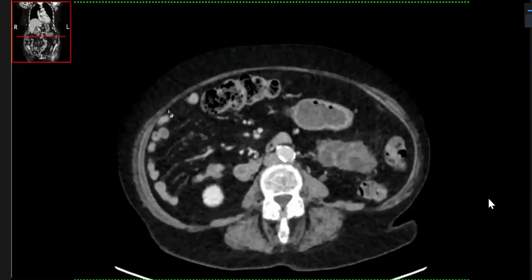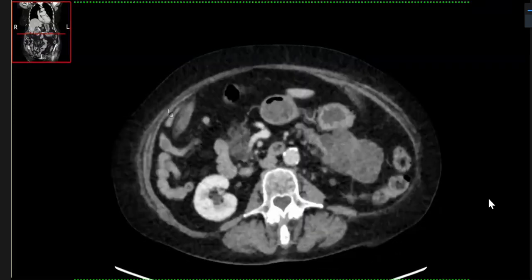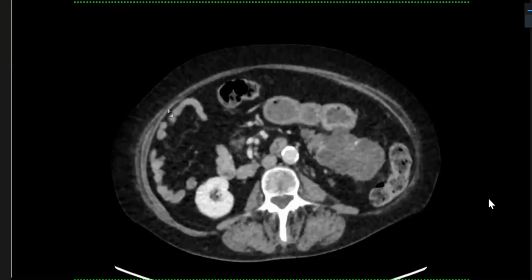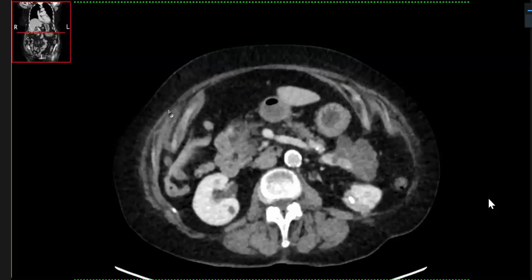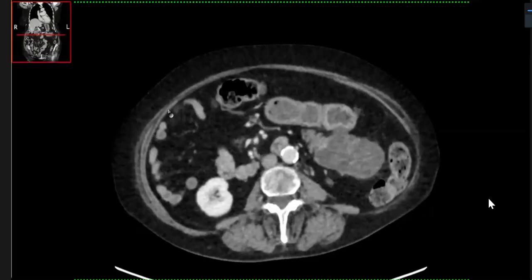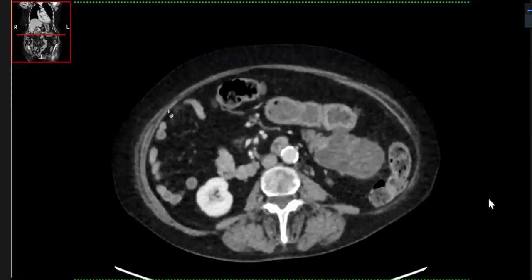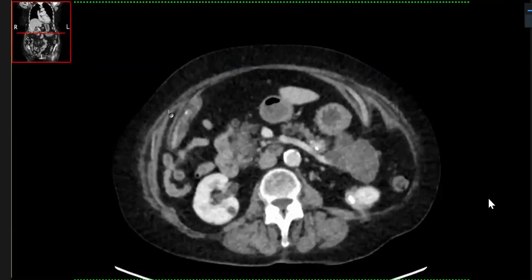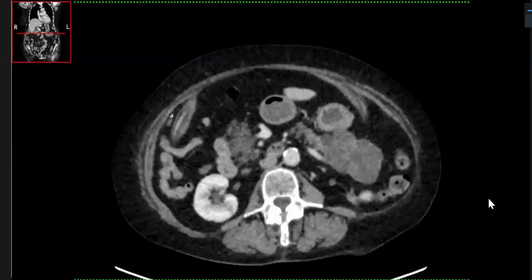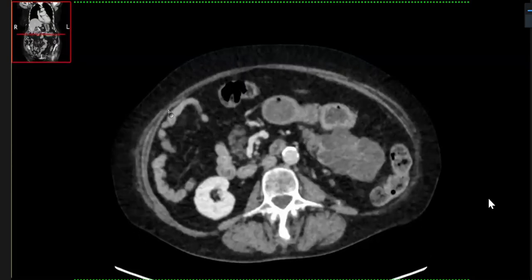So in summary, this is a cystic pancreatic neoplastic lesion, likely serous cystadenoma of the pancreas, and it is closely abutting the anteriorly placed bowel. It is in close approximation to the bowel. However, I do not see any fistulation. The fat planes with the bowel anteriorly are blurred. However, no vascular thrombosis. My top three differentials are serous cystic adenoma of the pancreas, intraductal papillary mucinous neoplasm, or cystic neuroendocrine tumor of the pancreas.